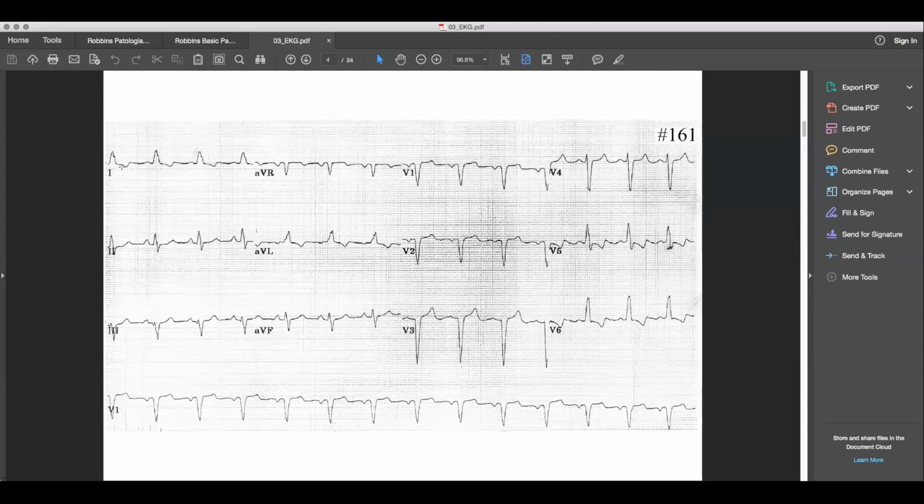All right, perfect. To start off with, we can see that this ECG is rhythmic. I counted around 3.5 boxes between our waves, which gives us 85 beats per minute. We can also see visible P waves, which indicates sinus rhythm.